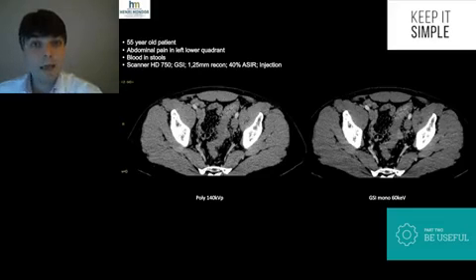And if you look at that image, well, of course, most of you will have detected that lesion here. That small lesion at the left portion of the sigmoid colon, and that image is a sigmoid colon tumor that enhances and that you can actually depict far better on the low kV levels. Why? Because there's more iodine in that. And that's why you can see the enhancement profile much better when you reduce the energy level of the reconstruction. And that's clinical practice. That's everyday practice.